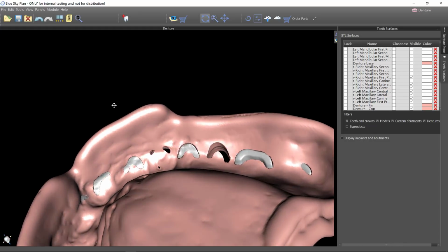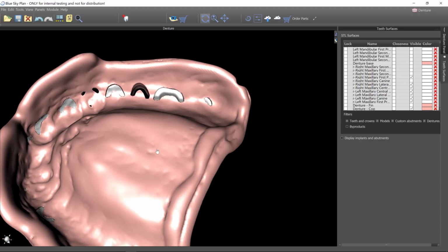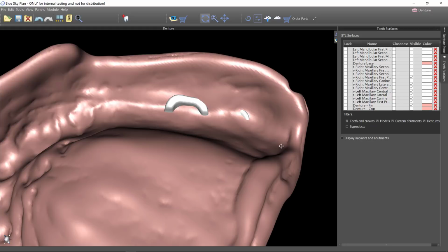This is going to be something that will get printed in addition to your final denture base, and this one actually allows the teeth to protrude through. And so what you would do is now pop the teeth through. Anywhere that they're protruding through this, you're going to take a lab handpiece and simply wipe that out. And once you've wiped that out, that is going to enable this to fit into this base.